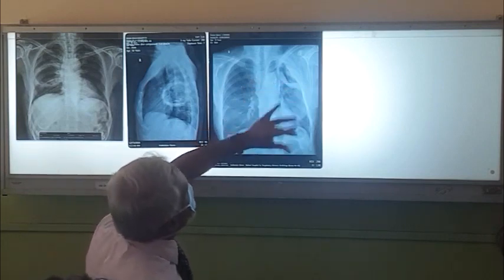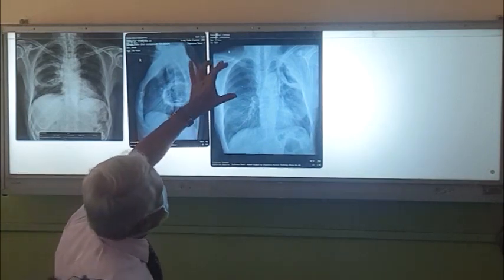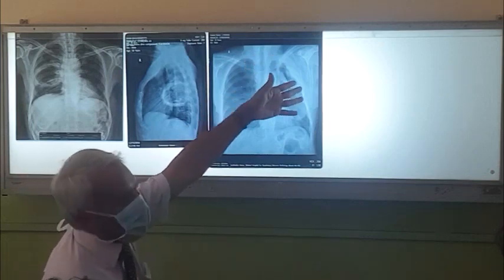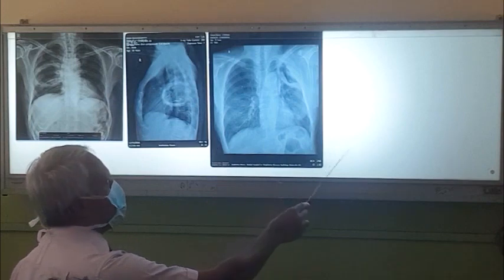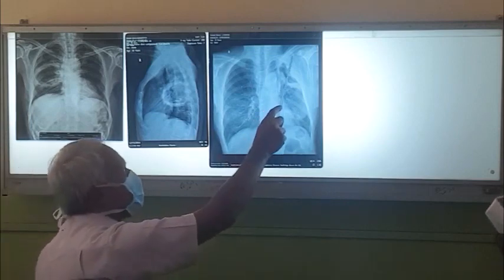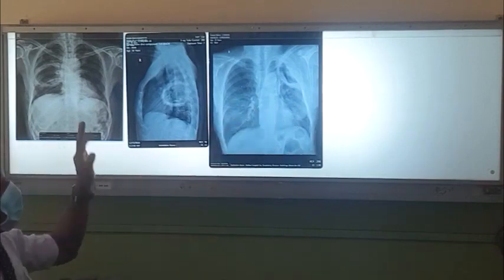So there is volume impairment in the left side indicating some kind of collapse there. In addition to that, compared to these ribs, on the left side rib crowding is there, right? Even the left hemidiaphragm is now coming up, right? So why I told you these things is, these are features of underlying lung collapse. Okay, the cardiac shadow, mediastinal shifting this way. Sometimes you can have tracheal deviation to the left side, so there is small tracheal deviation, and there is crowding, elevation of hemidiaphragm, volume impairment, right? All are additional features of some underlying lung collapse.